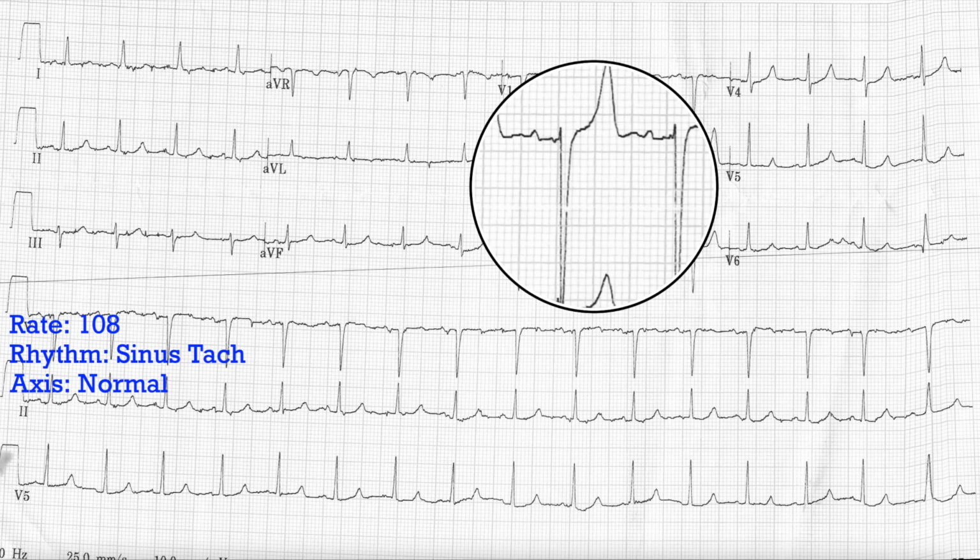That looks normal. Our QRS should be smaller than 3 little boxes. In this case, it looks like it's 1, 2-ish. So that would be a normal QRS size. And by the way, you can have a short PR, which I'm usually just glossing over because you don't often see it, but this one's okay.